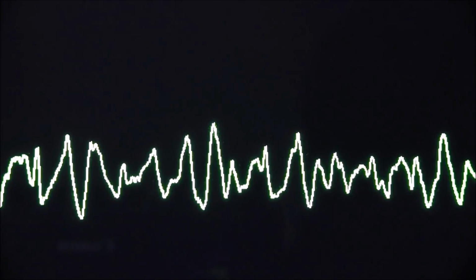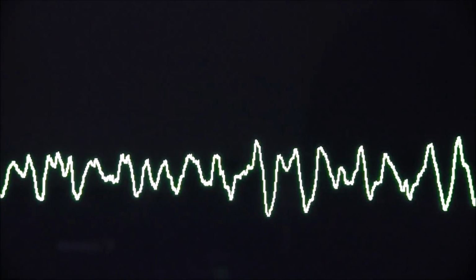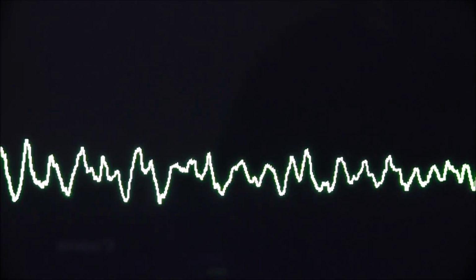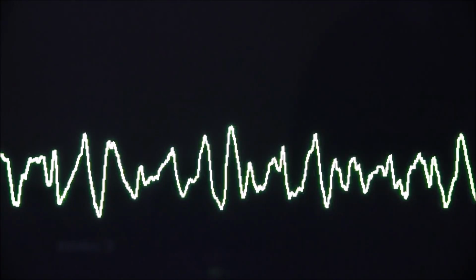So in ventricular fibrillation there's fast, chaotic, uncoordinated contraction of areas of the myocardium. Different bits of the myocardium doing its own thing. It's twitching and quivering. And in this rhythm there's no effective cardiac output. The blood pressure is going to be 0. Now the causes of this can be ischemic heart disease such as myocardial infarction, severe or congenital heart disease, electrolyte imbalance, rapid changes in the levels of potassium or calcium in the blood, for example. Could be electrocution, severe hypoxia.